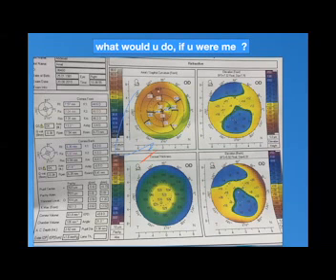The pachymetry, the thinnest location is 514. The pachy apex is 523, which is still within the accepted range. The difference is not more than 10, it is 11 actually, borderline.